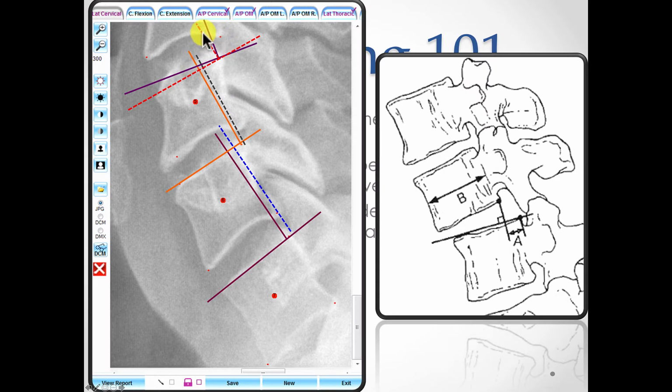Measure and drop that line down. So you can see in this dotted line, if we did it on where this little deformity is, and not the disc plane line, that dotted line now is perpendicular here. So if I drop a parallel line down from the vertebra above, you're going to see that it looks more like a retrolisthesis if this is on an angle, right?